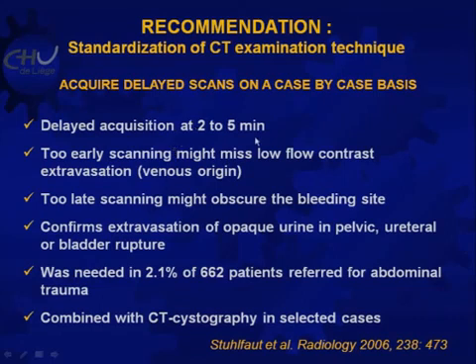2 minutes is a little bit early, but you can already see that there is extravasation of opaque urine, but it's better to scan at 5 minutes. Too late would obscure a bleeding site. The confirmation of opaque urine is almost always obtained if you are using delayed scans. Is it needed very often? Well, whenever you have a suspicion, and in this paper it was needed in 2% of the patients.